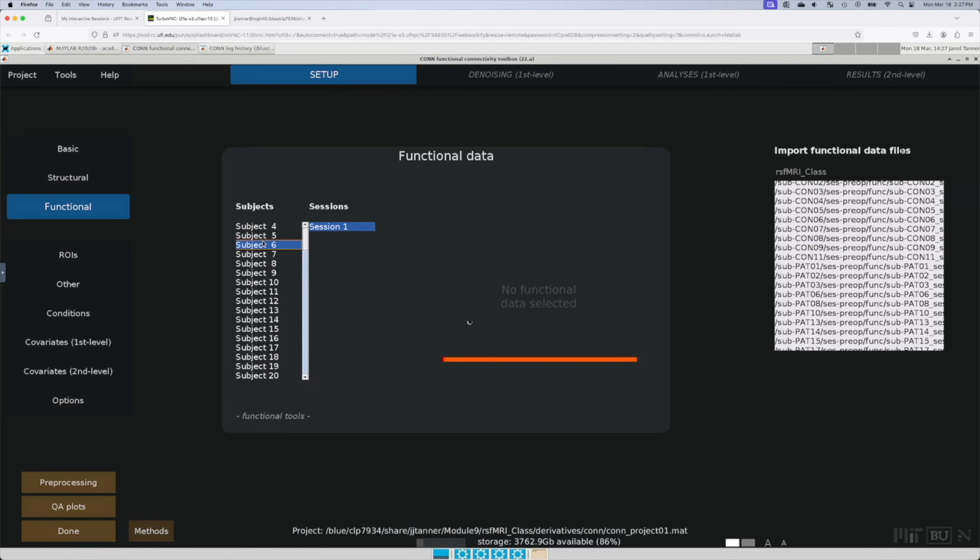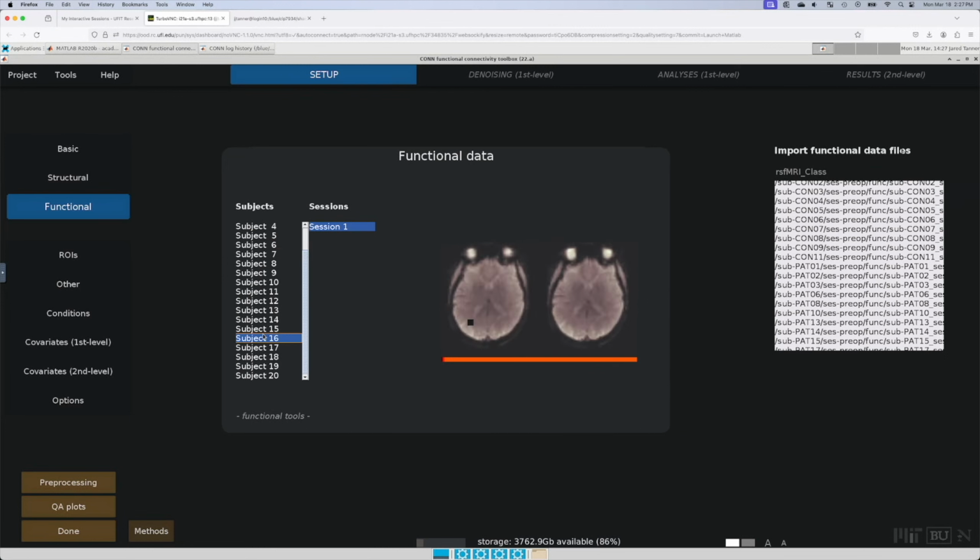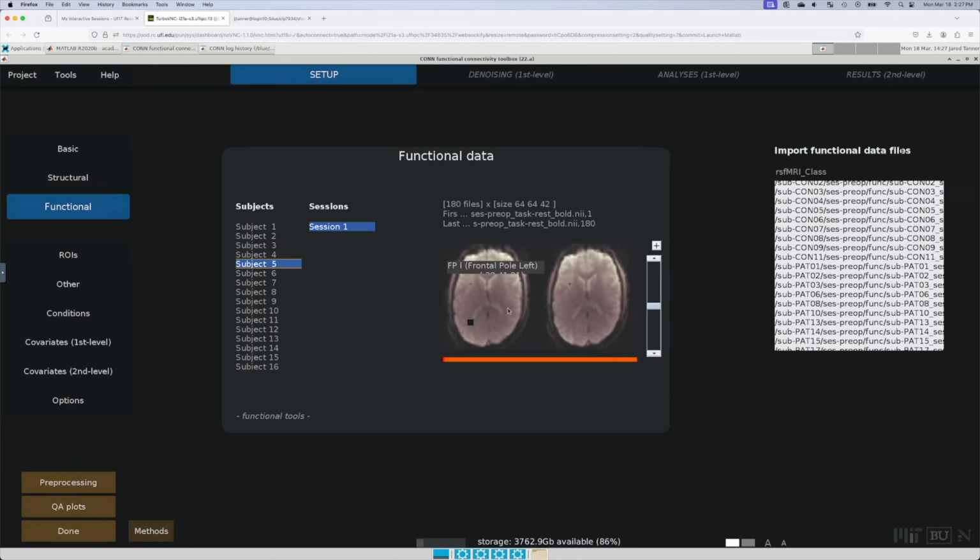So again, as before, I just want to show that the scans got assigned to each participant and that they look a little bit different from person to person, as they should. People's heads are shaped differently, and if we notice, these are not nearly as detailed as the structural scan. Resolution is lower, and that's because of the sequence. The functional scans generally are going to have a lower resolution, but it looks a little different because we're focused on patterns of blood flow and not so much the structure.